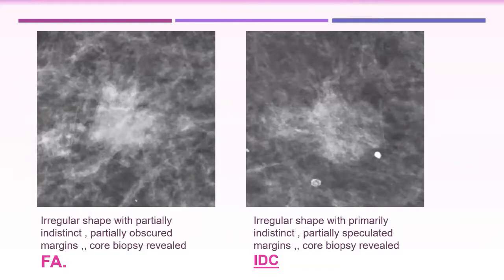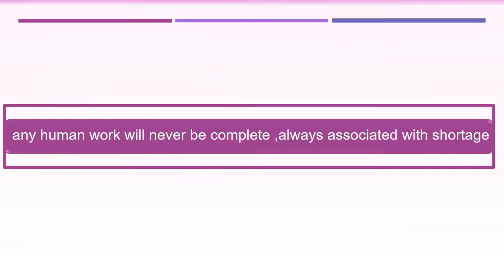I could see it, but in the invasive lesions, invasive ductal is more appreciable than in fibroadenoma. Yes. Okay. Thank you. Here it is seen throughout, but in the fibroadenoma it's seen at the periphery of the lesion, which is expected to be like that. Okay.